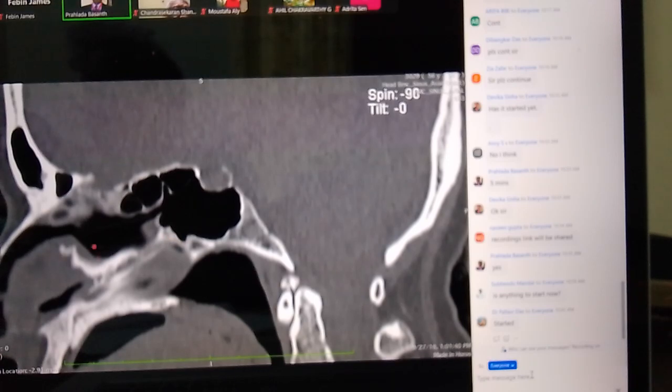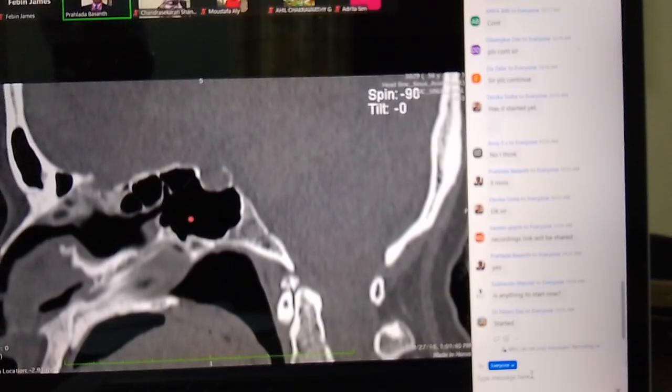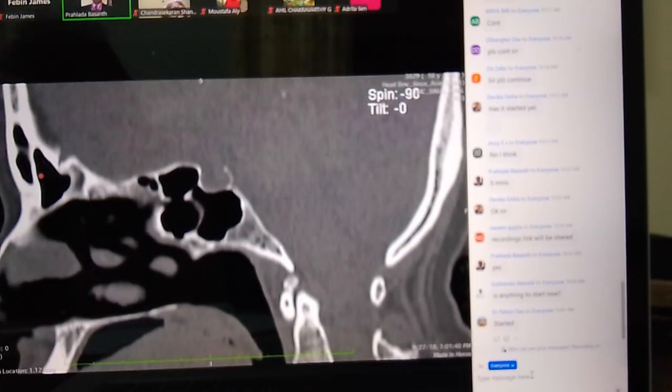This is all the vomerine bone, perpendicular plate of the ethmoid. Because of asymmetry, we don't see it in continuity. This is the cartilaginous septum, and this is the sella, and this is the sphenoid sinus. This is the frontal sinus, and maybe this is a supraorbital ethmoidal cell, part of the frontal sinus only. We have gone further towards the left side, still septum, and the sphenoid sinus. And this is again part of the frontal sinuses.